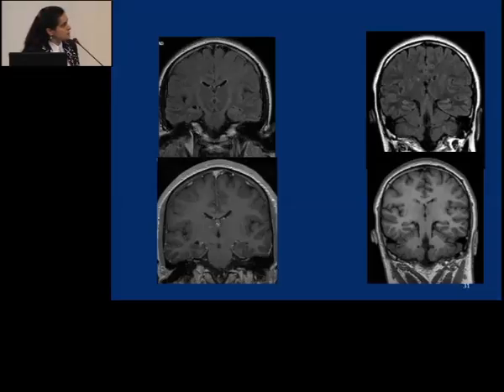It was reported in another hospital, and we performed another examination. So I gave another opinion. It was reported as a right-sided hippocampal sclerosis, but this is a choroidal fissure cyst. They even insisted that we apply contrast to be sure. This was the demand from the neurosurgeons.